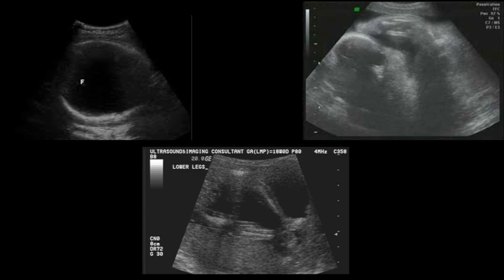Here are some examples of variable fetal presentations. So in the upper left-hand corner, we see a cephalic presentation. And we can tell this because we have a bright hyperechoic, smooth contoured oval with anechoic structures on the inside. And this represents the fetal head. And in certain views, we'd be able to see parts of the fetal brain, but our gain doesn't look like it's high enough in this image to determine that.